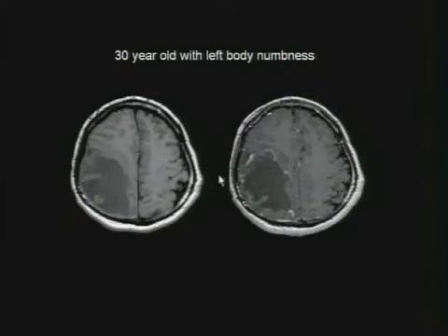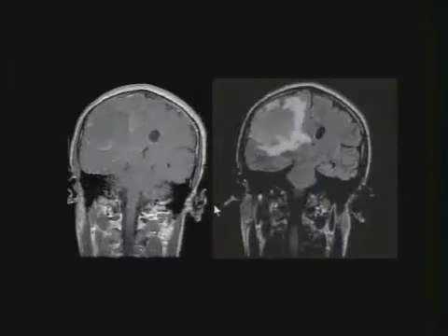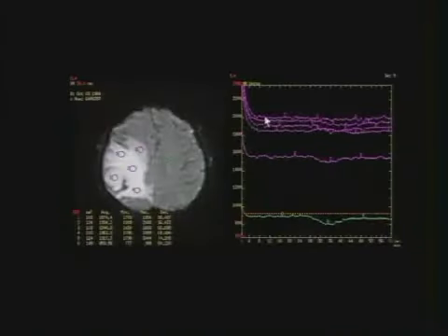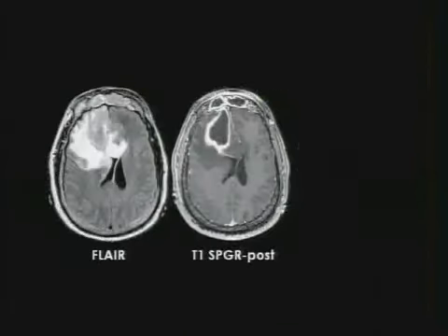This is a case from 3 weeks ago at UCSF. We all thought this was tumor. Look how huge it is. Incredibly large mass. What was bothersome was that on perfusion MRI it was flat. There was no abnormal vascularity. This is a resection-proven tumefactive demyelinating lesion. Always, always think of this entity in the back of your mind.